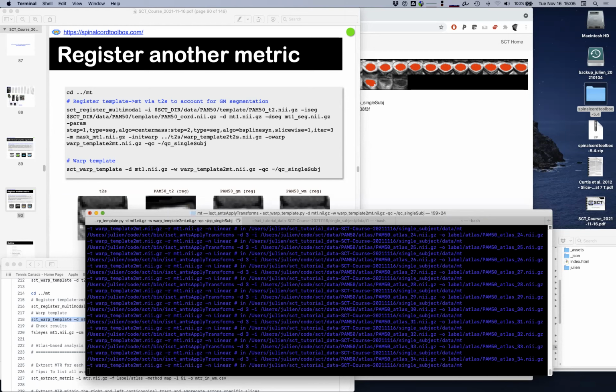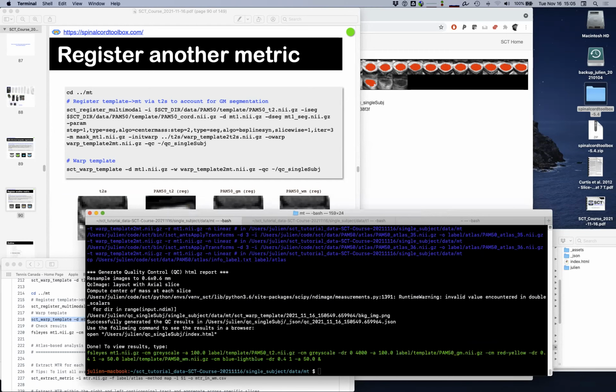First of all, the bad data could be bad anatomical data, bad metric data, or bad T2 star weighted data. For example, if I had bad T2 star weighted data, which is often the case because it's difficult to get good T2 star weighted data with a nice gray matter butterfly, I would typically avoid this step.